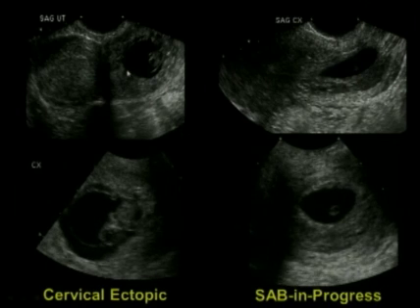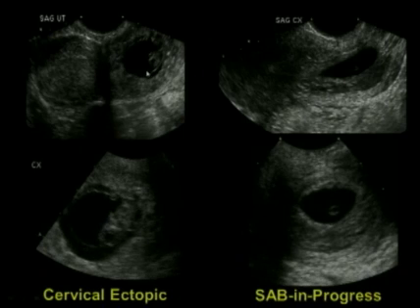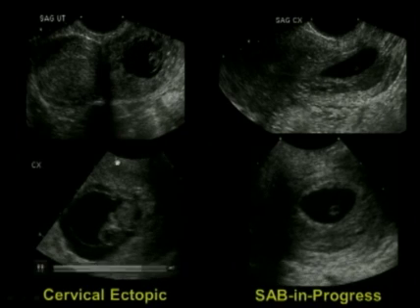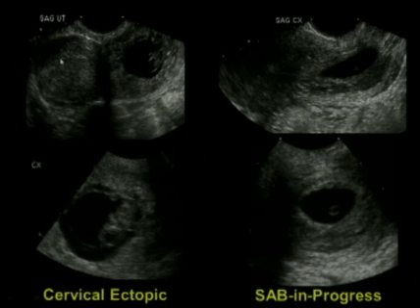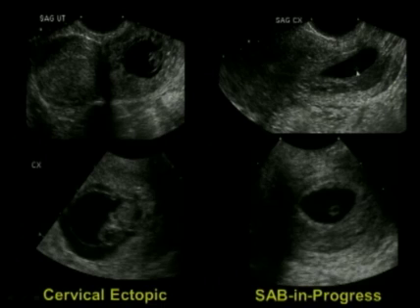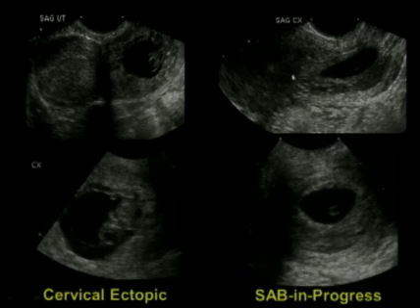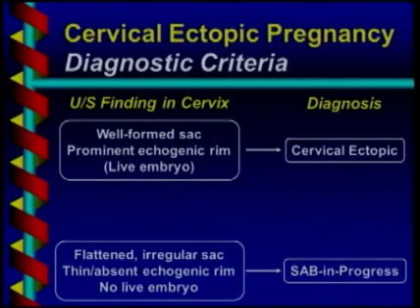The case on the left, this is one case where on sagittal view you see the pregnancy inside the cervix, and it looks like a normal gestational sac. It has an embryo with a heartbeat. The only thing abnormal about it is that it's sitting in the cervix instead of the body of the uterus. This is a cervical ectopic pregnancy. On the other hand, here you see a flattened gestational sac, little material in it, what looks like a yolk sac but no heartbeat. This is a spontaneous abortion in progress.